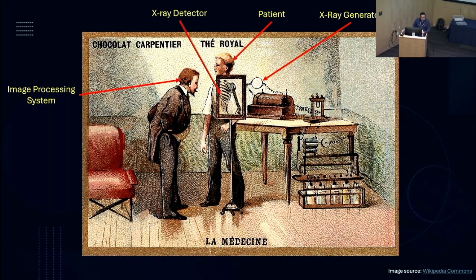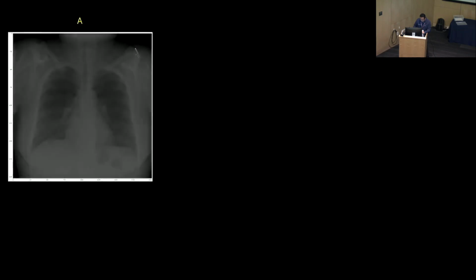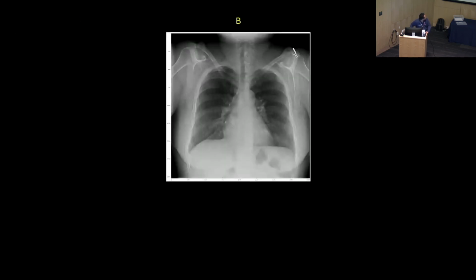Now I'll give you some chest X-ray images, and I want you to take a look at this for a second. We have this first image, second image. They are the same patient, but there are 3 different images for this patient.